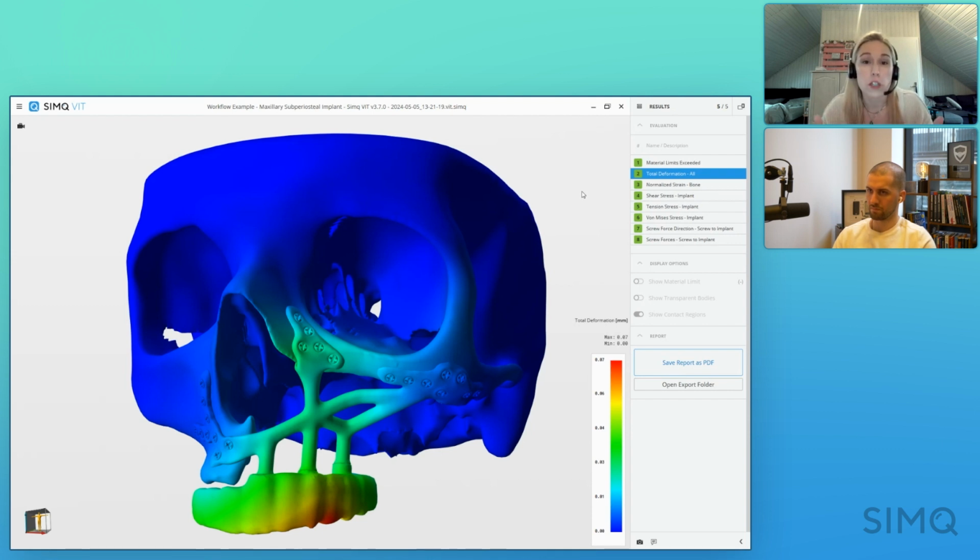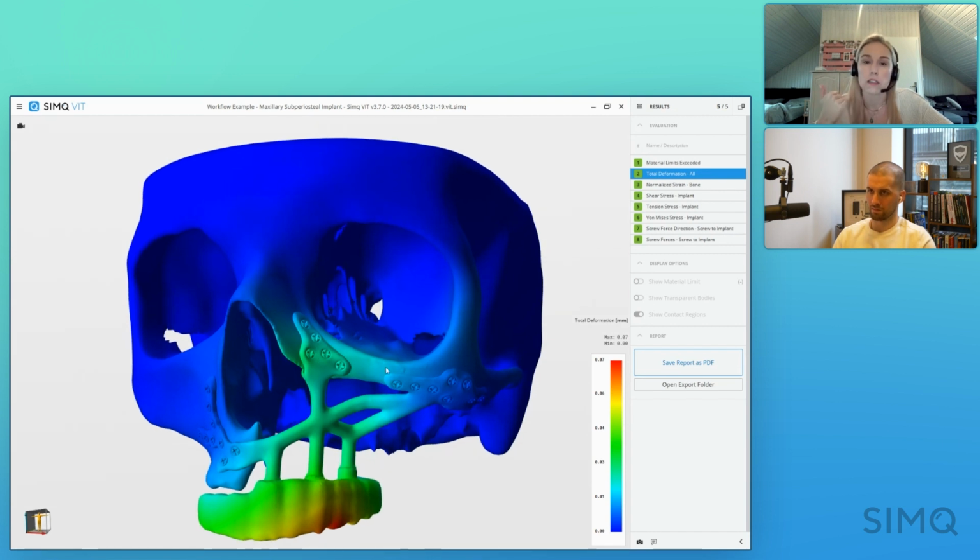The engineer would know the normal force would be this, and then you could say, okay, let's try to lower the Newton force a little bit and change that design. Like I said, maybe add a bar here, or if it's acceptable between the engineering and the surgeon and the bone quality is good, then the surgeon will know, okay, yep, there's strong bone here. This was removed, but we have a good zygomatic arch here that can support that, and I feel confident that that's the right implant design for this patient.